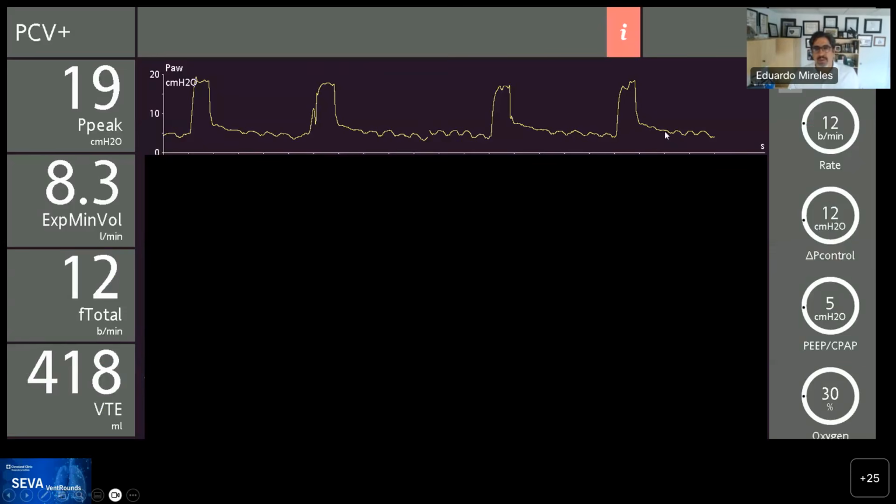If you saw this waveform, would you say, oh, there's something terrible happening to this patient? Yeah, there's a high frequency oscillation in there. Yeah, these little things, right? But you could say, yeah, it's cardiac oscillations, whatever. It's just noise. Clinically probably irrelevant, those little things, right?